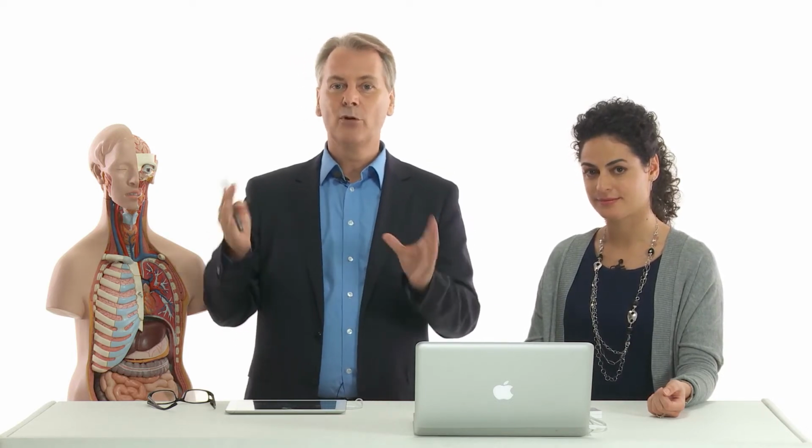So the simulator is very cool. Yes, I like the simulator because it gives you a very good appreciation for the structures and what is bordering which structure. And if you ever have the chance to work on the simulator, do it. I learned a lot from it. There's only one thing that the simulator cannot do, and that is help you understand the positioning and the habitus of the patient. And that truly makes a difference as well.